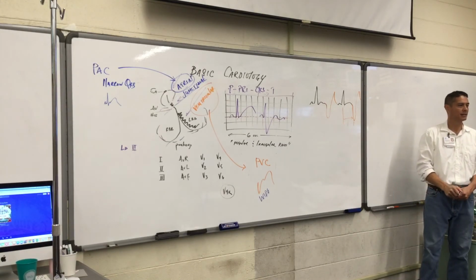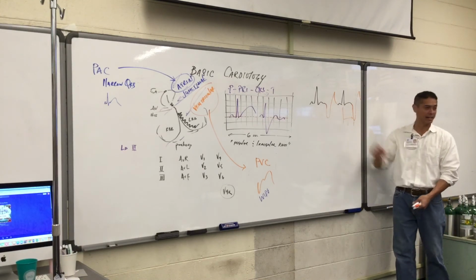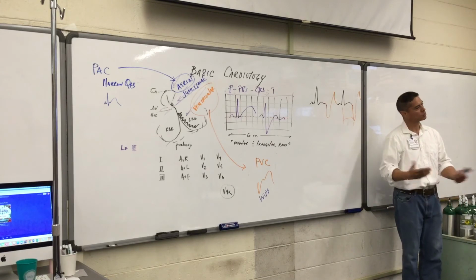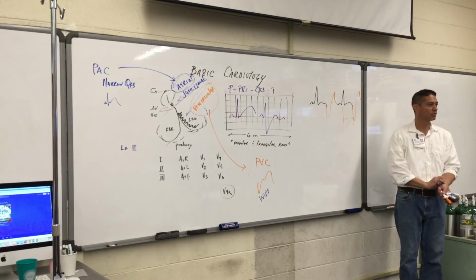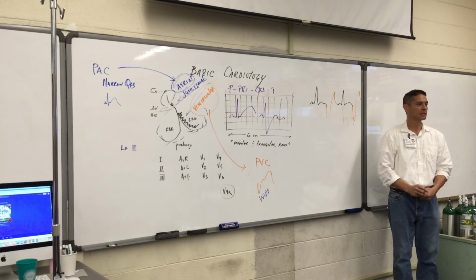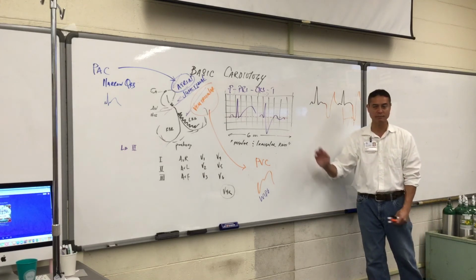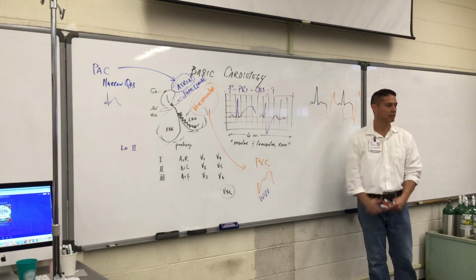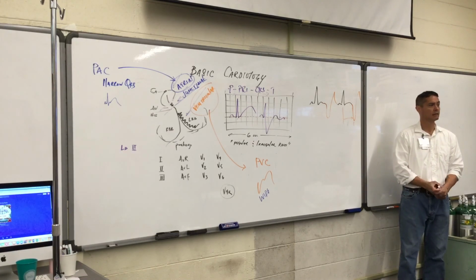So they're bradycardic, really. When you feel the pulse, you'll feel a pulse deficit, because you'll feel the sinus complexes, the ones that you can have a pulse felt with them. And then you have no pulse, because I just told you there's no stroke volume with the premature ventricular complex. So again, when you're looking at the rhythm and you're trying to determine, look at the patient. Check to feel every beat with those complexes as you see it go across this EKG screen. And if it's a wide one and it has no pulse, you pretty much determine that I think this might be ventricular in nature. But more of these will cause the person to be lightheaded and faint.